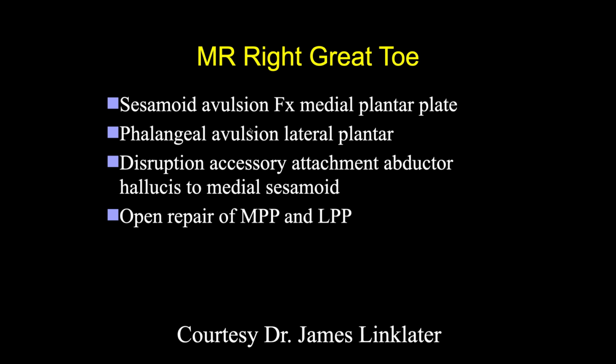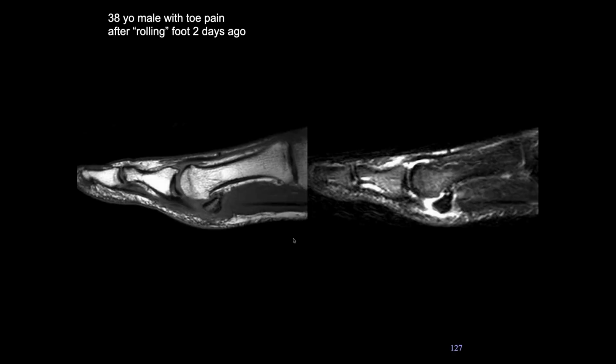So the things you typically look for are fractures of the sesamoids, phalangeal avulsion of the lateral. Oh, this is in this patient. Sorry, open, and they went and did open repairs of these injuries. Ballerinas and long-distance runners are the most common individuals to have these problems.